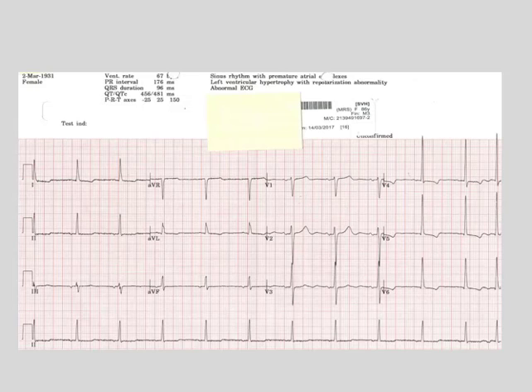Coming on to the next slide. Now, this is not that abnormal looking. What have we here? Sinus rhythm, although barely perceptible, but you measure them and you find they're regular. This one is a little shorter. That's probably an atrial ectopic. And normal axis. Any Q waves? Hypertrophy. I thought of hypertrophy because of the height of these R waves, which is what stands out, and that is the giveaway in this case.